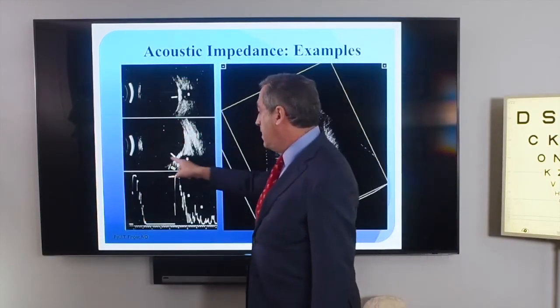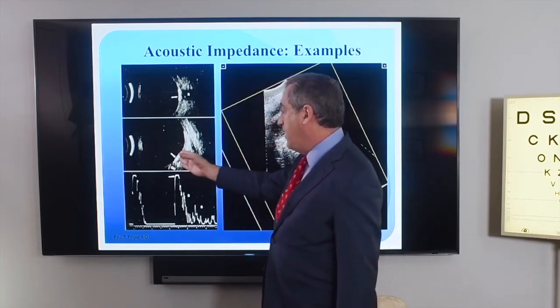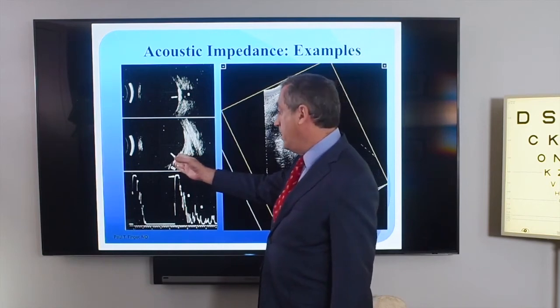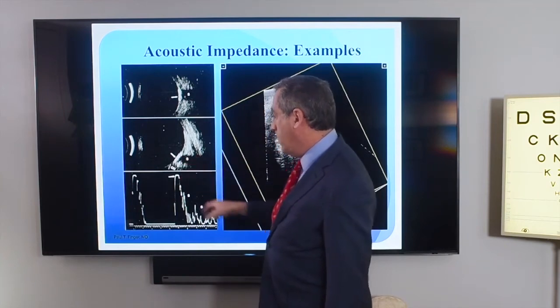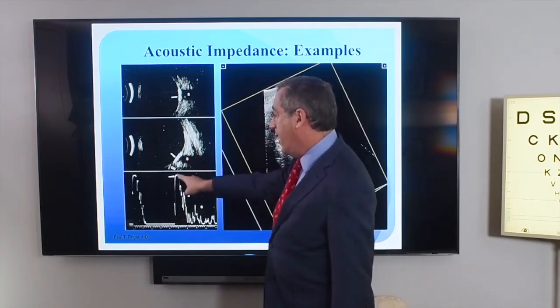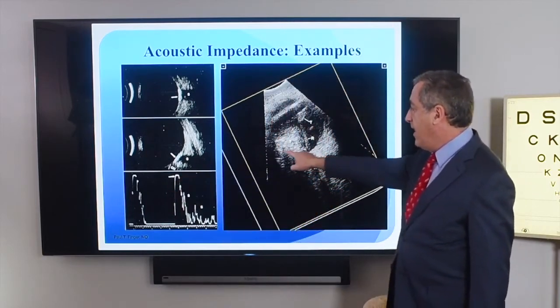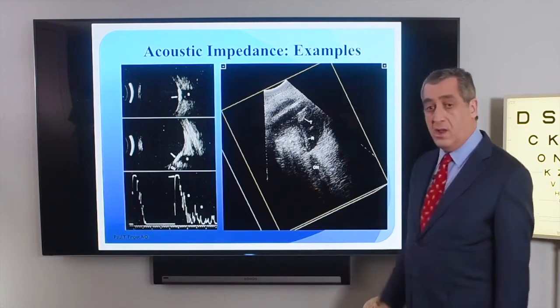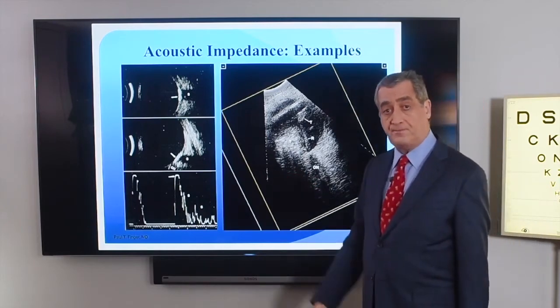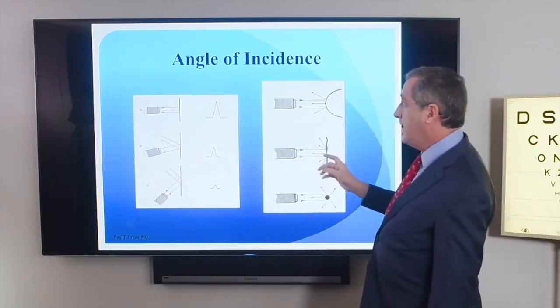Here's the eye. And here's a choroidal osteoma, where the vitreous has low impedance, and then it hits the high impedance osteoma, which has such a high reflectivity that it causes shadowing in the orbit. Here's an A scan showing the high reflectivity of that tissue. And here's another clinical example where we have a tumor in the eye with lots of spikes of high reflectivity with shadowing into the orbit. This is a retinoblastoma.